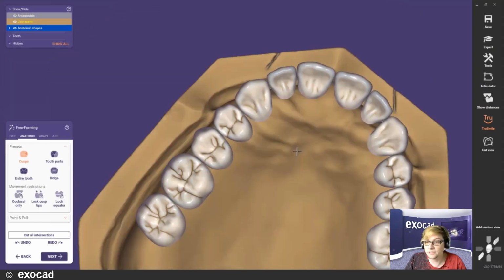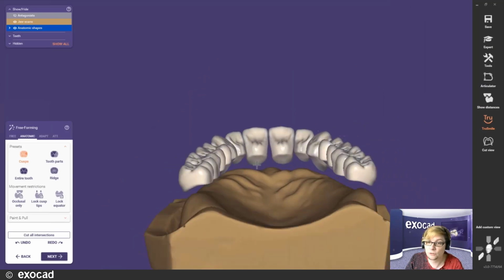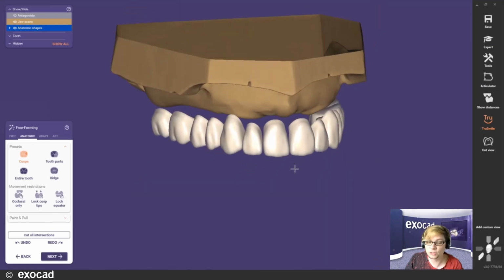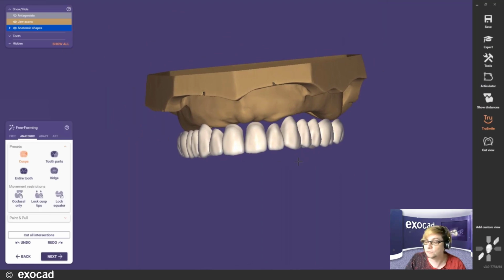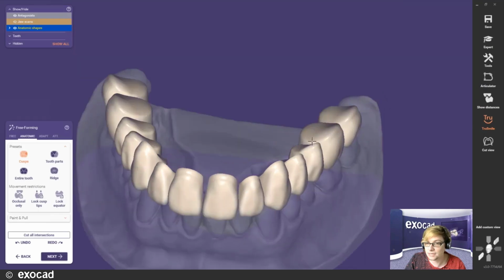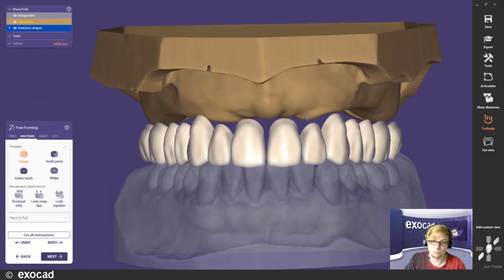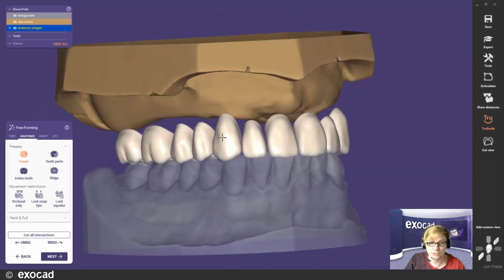I mean, if I'm going to print the teeth myself, the shape doesn't really matter for the software. As you see, we changed the generic tooth library a little bit. So here the base is shorter. This is only for the full denture tooth libraries. You might have seen in the selection, we also now have very many different sizes of generic teeth available for the dentures, since they are based on stock teeth. So for the examples, it makes perfect sense to have different sizes here. And also for the full dentures here, the bases are shorter. So if you produce this to be printable or millable and to be placed in a gingiva base, there's enough space here to place them and you don't have to trim them every time.